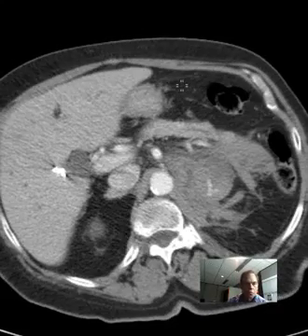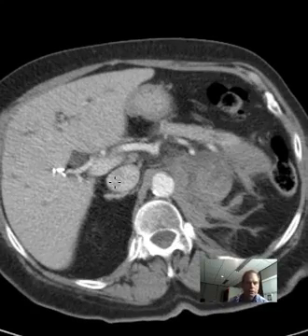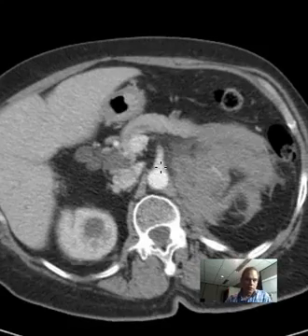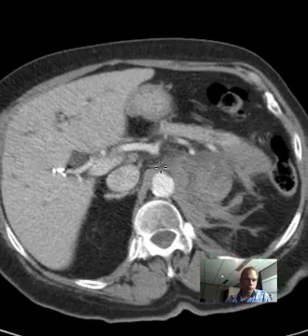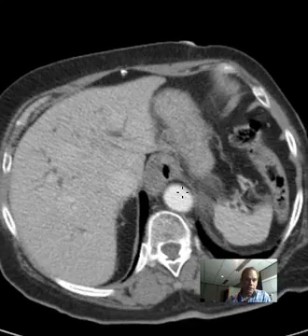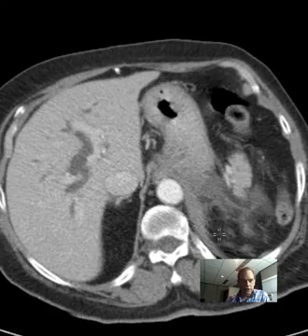Anatomically, liver, we went through that. Look here, this is the porta hepatis. That's where three major structures course, and they are the hepatic artery. The hepatic artery is one of the branches of the celiac artery. So if we go up here, there's two branches off the abdominal aorta. Going downward, let's go up to the aortic hiatus. So we see here again the esophagus is going through this hiatus between the right crura, or the right crus, and the left crus of the diaphragm.